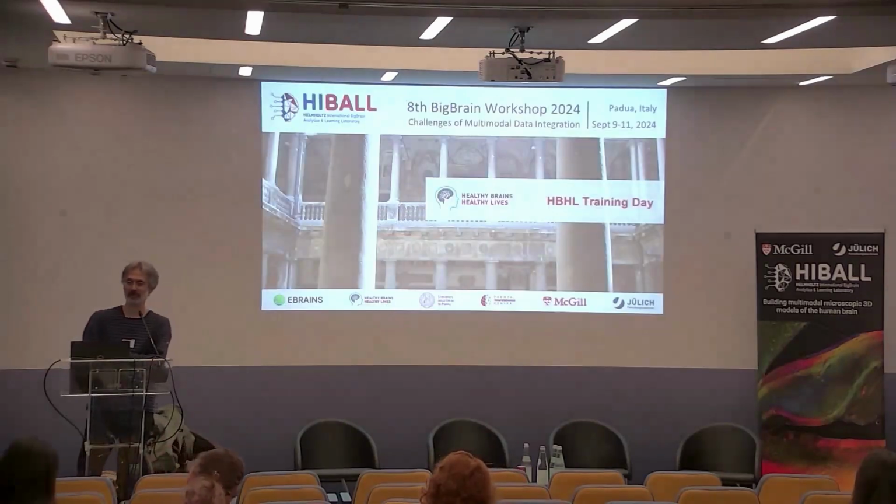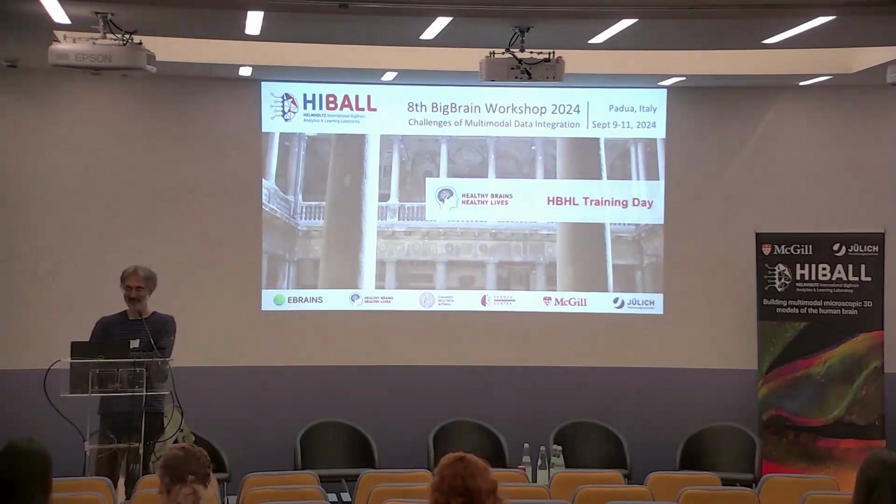The first one is, you use a label, you give names to the sulci. Where do you take the names from? I mean, which atlas do you use? Good question. And the other one is, so you can do everything you describe. Oh, by the way, it is a beautiful tool. You can do what you want with the normal brain, but what about a stroke or a tumor or whatever?